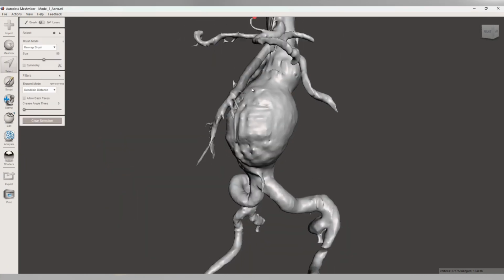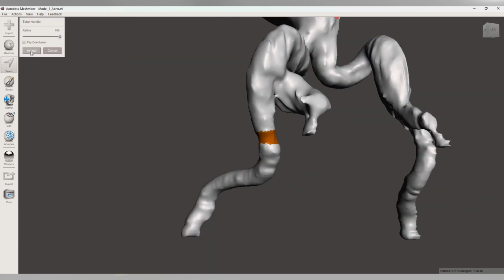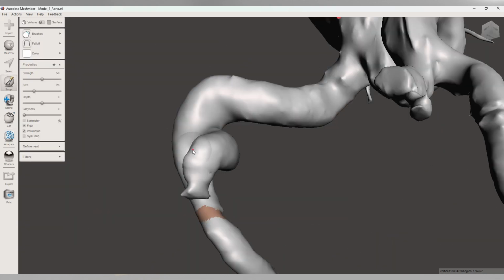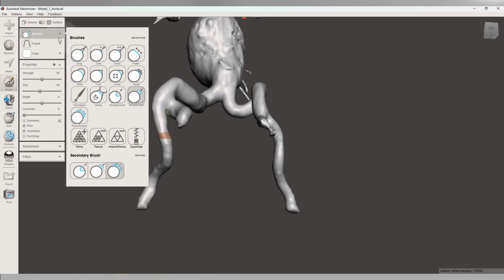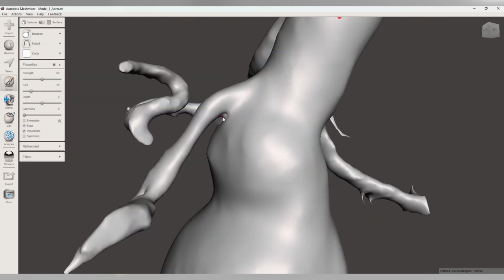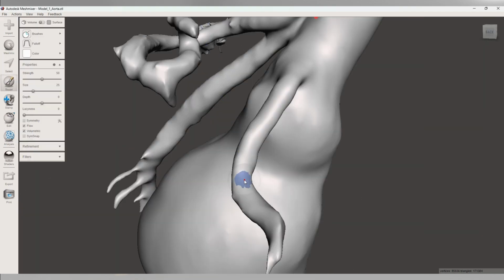Using Meshmixer for the 3D post-modeling, we removed all defects and inconsistencies. Remaining gaps and holes are filled to get a closed, vessel-like surface. When working on the digital model, it is important to be very careful not to change the size of the model or remove relevant structures. Remember that the final product must be a detailed replica of the patient's anatomy.